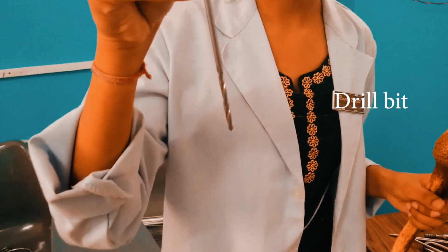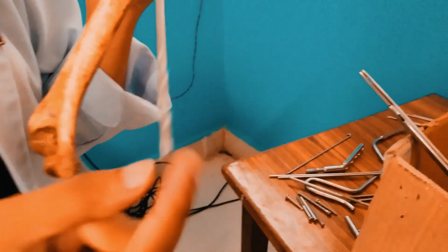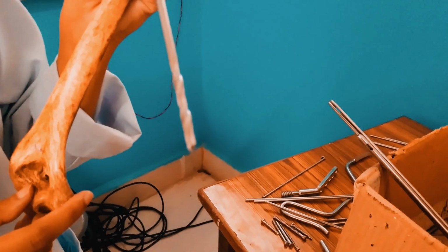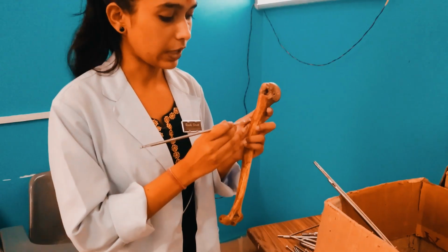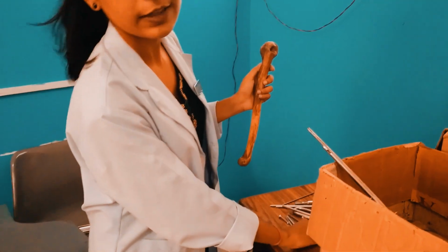The drill bit consists of peculiar spiral flutes, and these are used for making the pilot hole. First, this is used to make a pilot hole anywhere we want to insert the screw. After using this, we will insert a depth gauge. We do not have a depth gauge here.